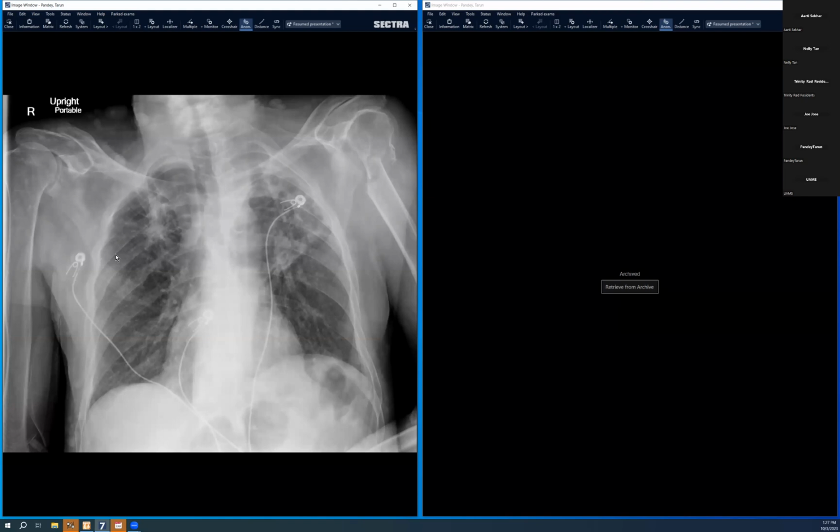TB, yeah, absolutely. Fungal, TB, sarcoid can do that. Pneumoconiosis can do that. Chronic... taking me back to my chest rotation days as a resident. But the clue is right there in the radiograph of a rare entity which can do that. There's a fracture in the left proximal arm. Yes, the patient has a broken arm, a deformed-appearing humerus. Yes, pathologic fracture.